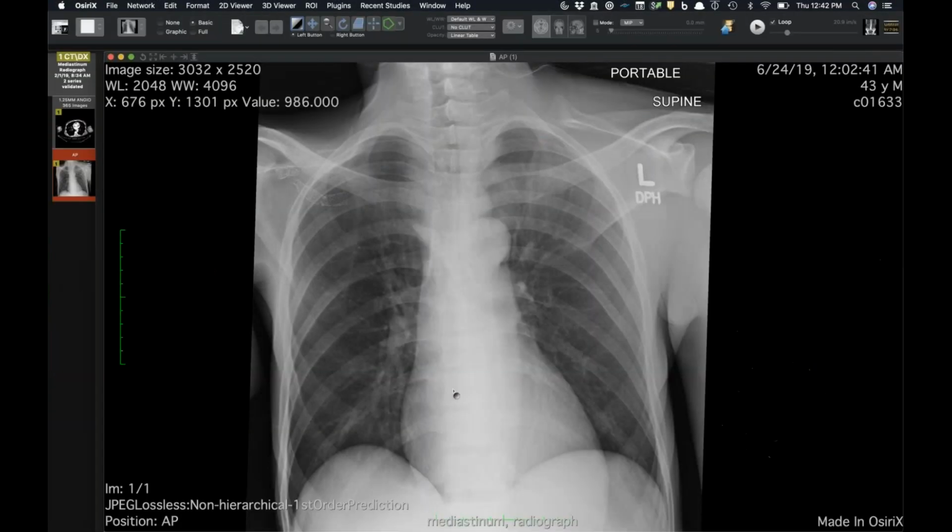Now, I'll let you guys look at this radiograph and see if anyone wants to comment on anything. This was just a portable I saw. It's more of just a curiosity and a fun little finding. Is that a renal failure patient? The bones look funny, and it looks like a venous stent. Yes, they have been on dialysis.